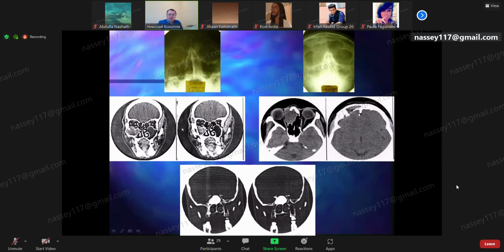After that, several CT. When we do CT, we have too many pictures in many projections. We cannot show all of them here, only the more interesting. This is one patient. X-ray CT of paranasal sinuses, frontal view. White color is bone. Black color is air. Gray color is soft tissue and fluid. Here you can see the orbit, nasal cavity, nasal septum. Here it's deviated.